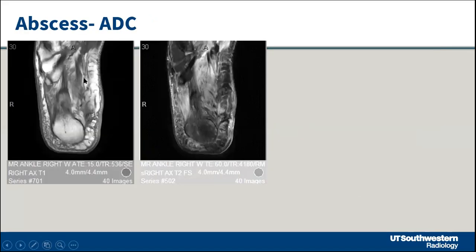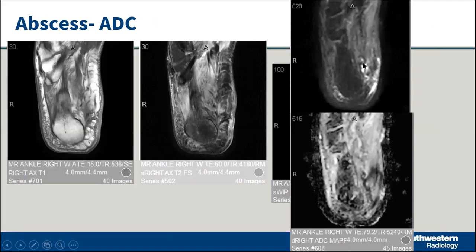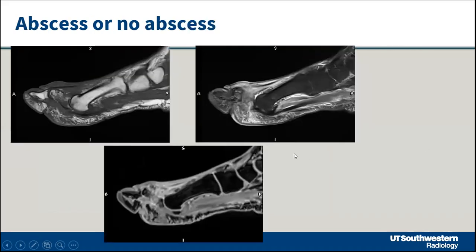Versus these kinds of cases where you have a hard time finding any abscess. This is contrast. If you look at DWI ADC, these are the pus pockets. Very easy to see. The area closer to the ulcer is not going to restrict much. But remember this appearance: the pus is darker on the outside and less dark inside, where there's less restriction. It's still getting organized. I'm going to show you a case which is opposite of that.